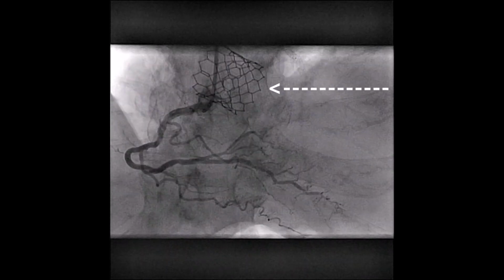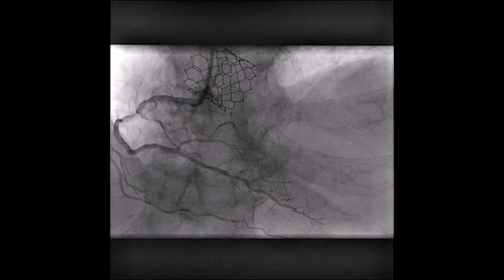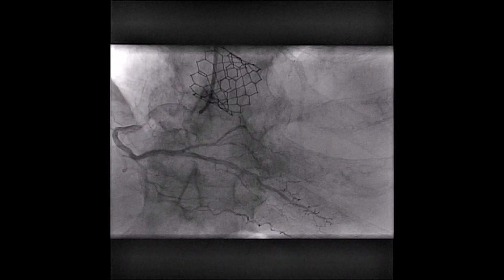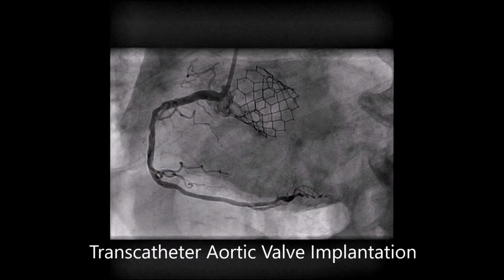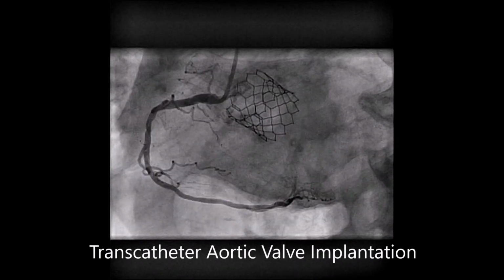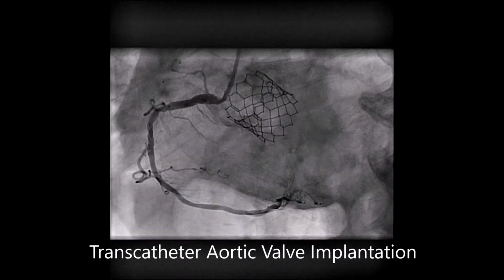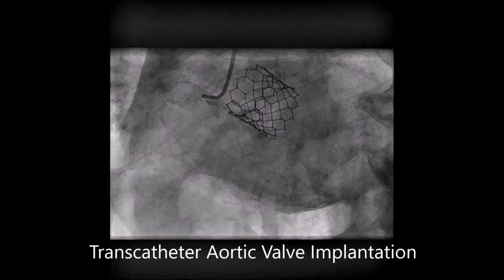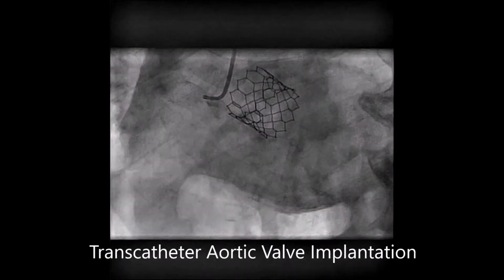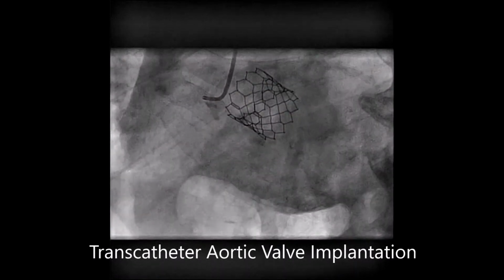Do you know what the radiopaque and cylindrical structure that dominates the image is? Because of course it is not a coronary stent, although it is implanted in a similar way. It is actually the percutaneous aortic valve prosthesis that was previously described in the history. These prostheses are known as TAVI, and as you know, they have been a true revolution in the world of interventional cardiology, as they have allowed us to treat patients with severe aortic stenosis who could not have been treated before. And although there is much more to say about it, this is a topic for another video.